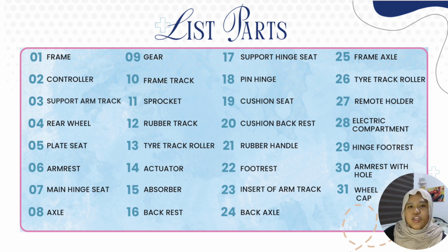adjustment. So the last one is the electrical and control related components, which include the control remote holder and the electric compartment, which manage the wheelchair operation and power storage. So all these components were designed and drawn one by one by us to ensure proper fit, functionality, and ease of assembly before forming the final multifunctional wheelchair.